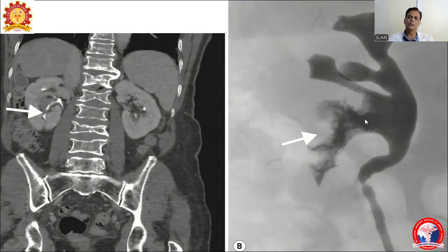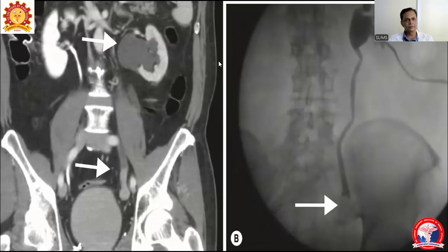pathological lesion into the calyceal system and pelvis, that region is showing ill-defined margins, as well as the amount of excreted urine shown here is very less. This is the neoplastic entity. We'll go a little faster.